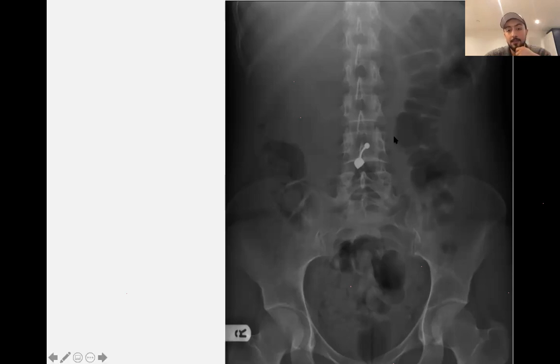But this one is basically a tummy piercing. It's nothing abnormal, no stones in here, nothing worrying. It's just a tummy piercing, and it appears in that way. So it's always important to keep in mind some artifacts are probably going to be there in the X-ray. Not everything you see is an abnormality or pathological finding. You can have some jewelry, people forget things on them, or piercings or any other things.